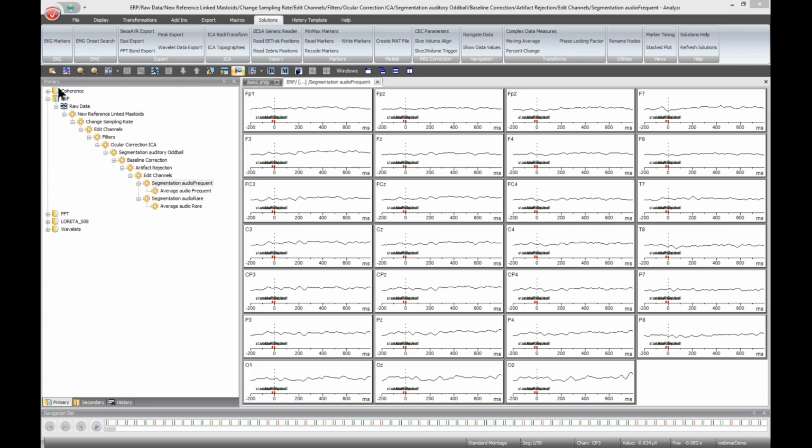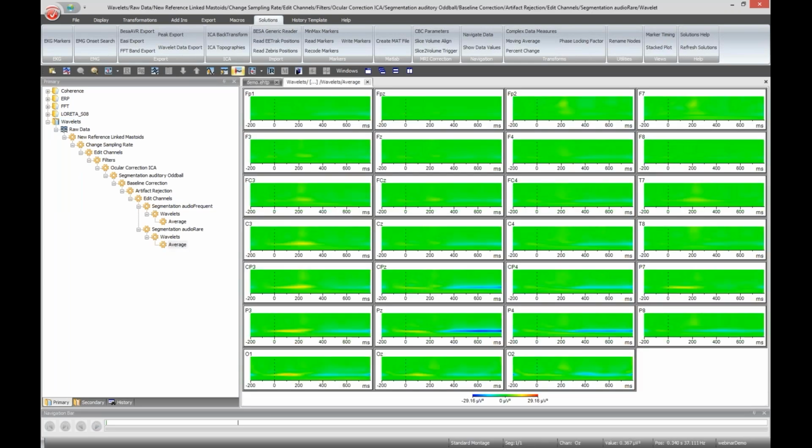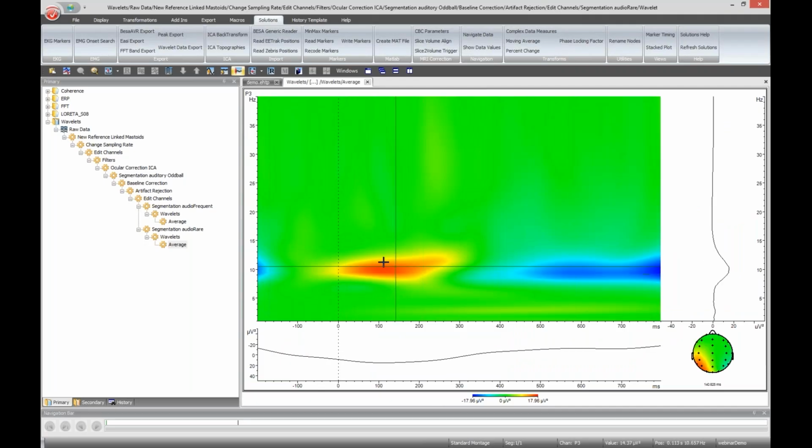This workspace is not really suitable for showing it, but I can do it in theory. Imagine you have all your subjects in here and you process them in the same way. You mentioned wavelets, and yes, this was just for one subject, for all channels for this subject, and then I showed, I guess, this one here.